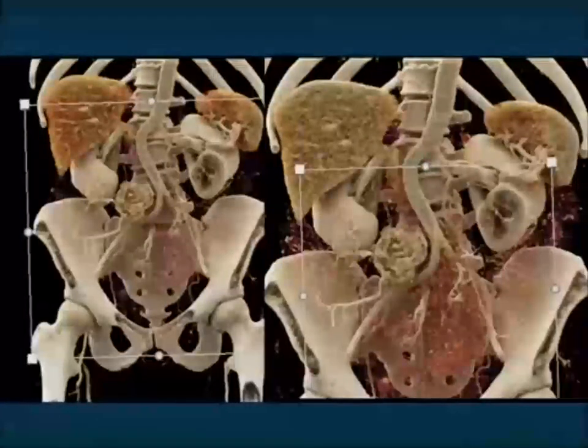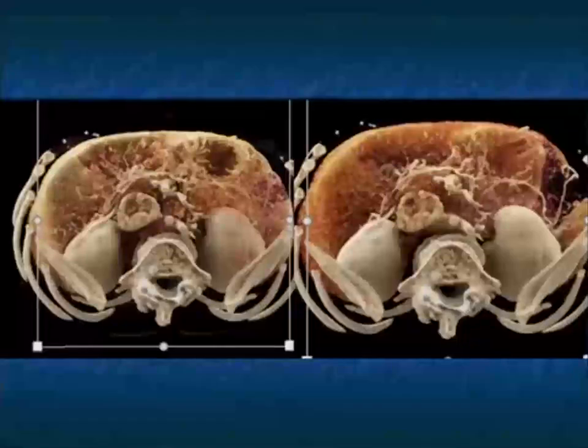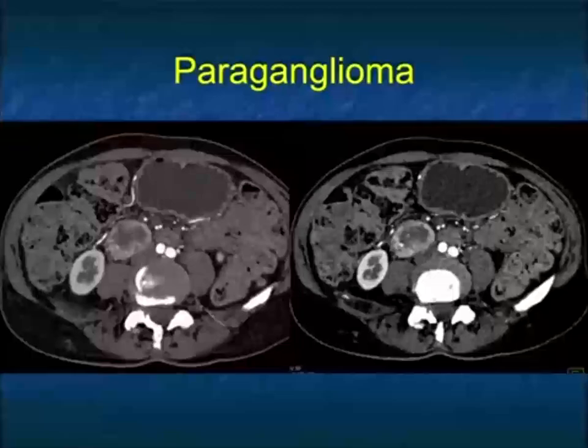The number of things you could think about, and I mentioned some of them, tumors and things like that, but what kind of tumors are vascular, well-defined, kind of sitting over there in the paraganglionic region, and a very classic one is a paraganglioma, okay? Paraganglioma is a really nice example of one of those possibilities. A really great case, right?